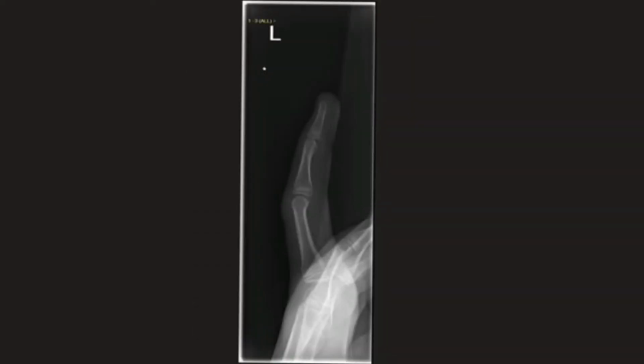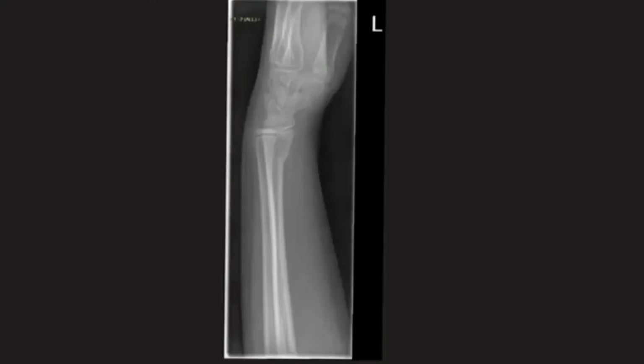Again, on this X-ray, we can see a similar cortical bump or irregularity in the posterior cortex of the proximal phalanx of this digit, again in keeping with a Torus or buckle fracture. Looking closely at this other lateral wrist X-ray, a similar appearance is seen on the anterior cortex of the radius, just here, and here is where the buckle fracture is.